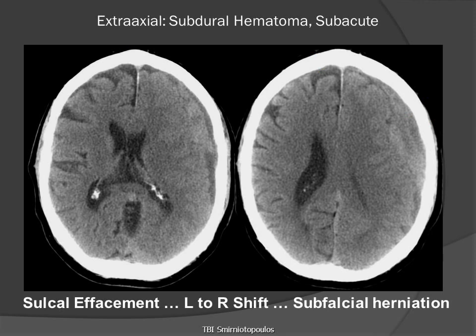If we look at this pair of axial cross-sectional CT images without contrast, we notice immediately an asymmetry in the size of the cerebral sulci, which appear to be effaced over the patient's left hemisphere. There is also an extra-axial collection that is almost iso-attenuating to the underlying gray matter. We can see in the dotted line the interface between the extra-axial subacute subdural hematoma and the underlying brain.